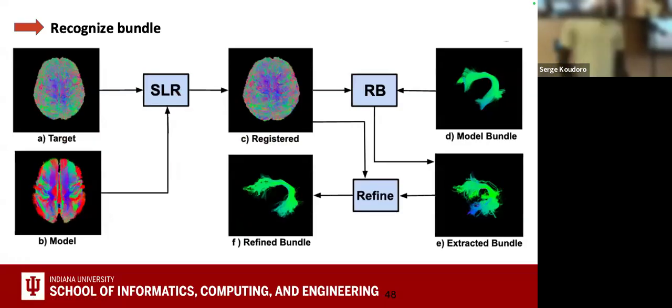To do that, we have different command lines named DiPy SLR, DiPy recobundles, DiPy refine, that permit us to do that.